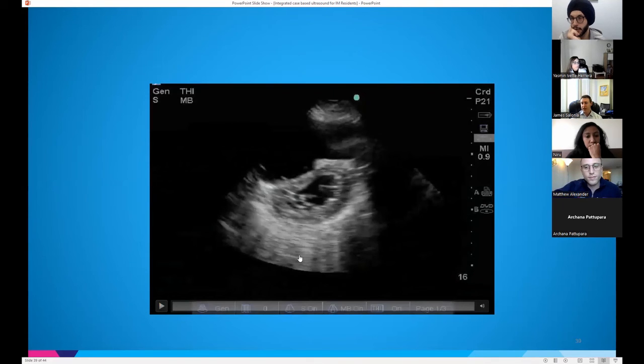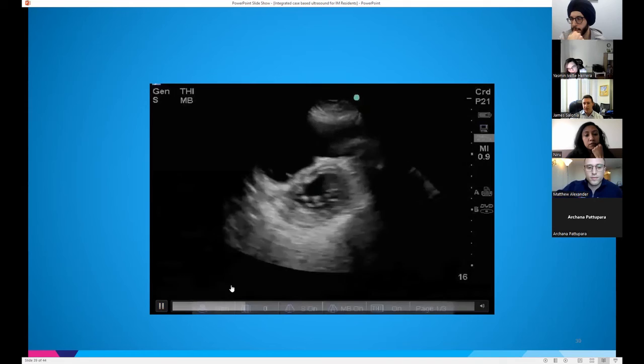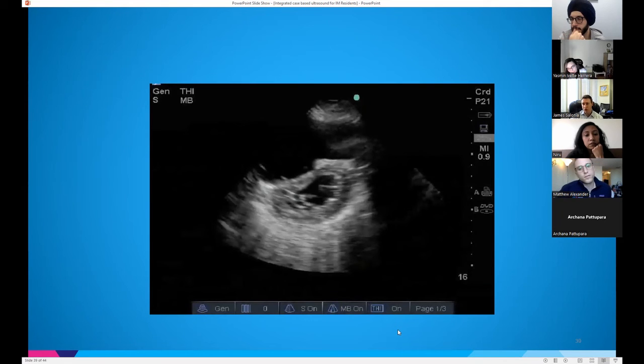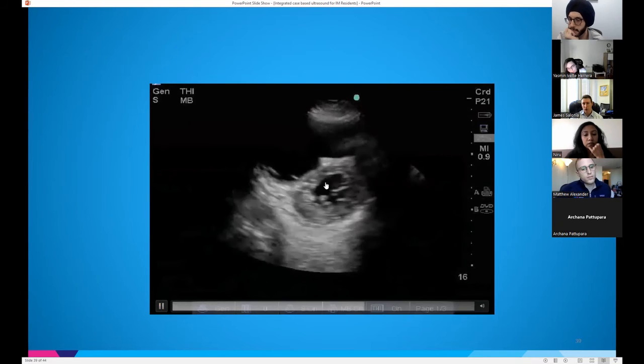It's important when you're looking at the septum, is it going into the LV during systole or diastole or both? If it's occurring during systole, that's a sign of RV pressure overload. If it's occurring in diastole, it's a sign of RV volume overload. Very difficult to just eyeball it. With ultrasound, you really have to have EKG leads so you can see the QRS complex, know when you are going into systole, know when you are going into diastole. But definitely we see that paradoxical septal wall motion, right?